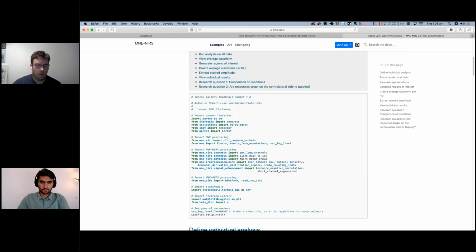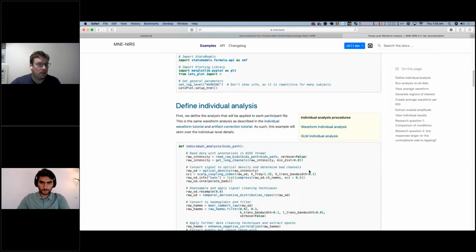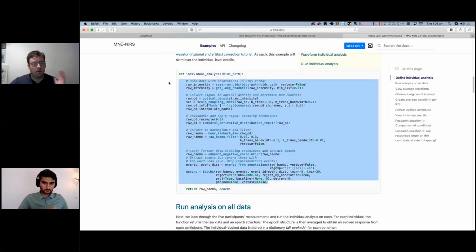I will go through it because it's interesting. It's very similar to the GLM. So you define this individual level analysis, and that will return your epochs per person. All the code here is exactly what we went through in the last webinar. So you just package up that individual level analysis into a single function.